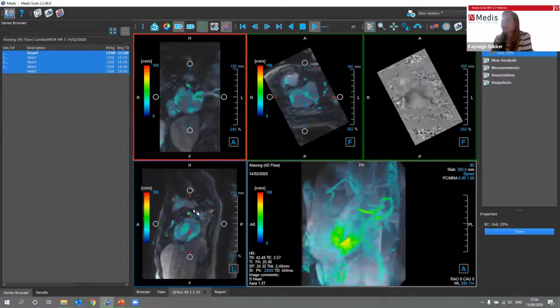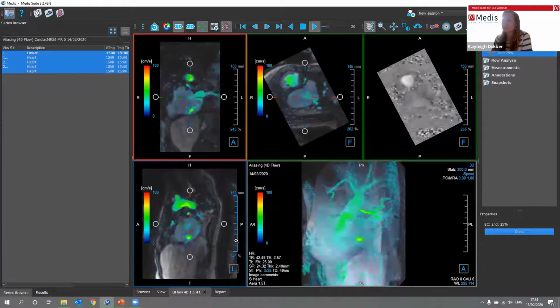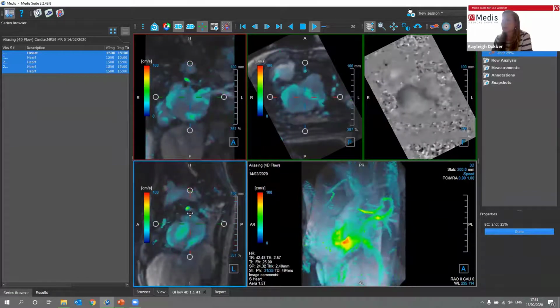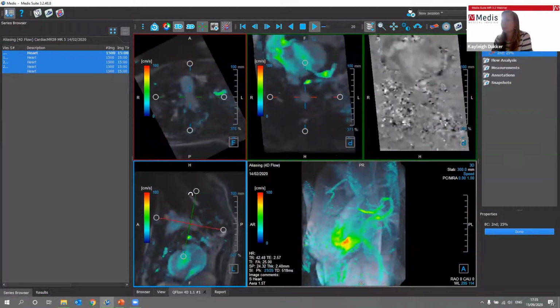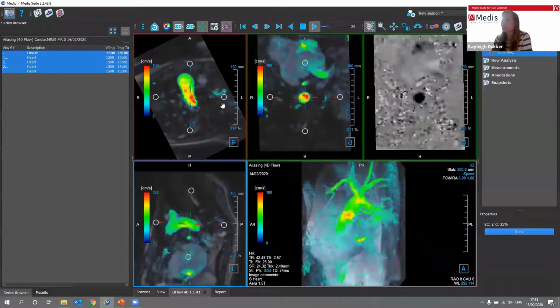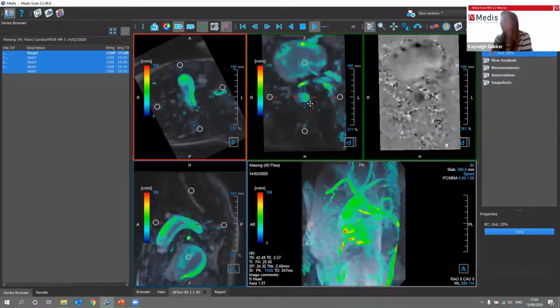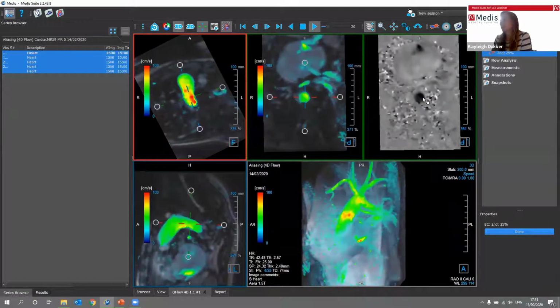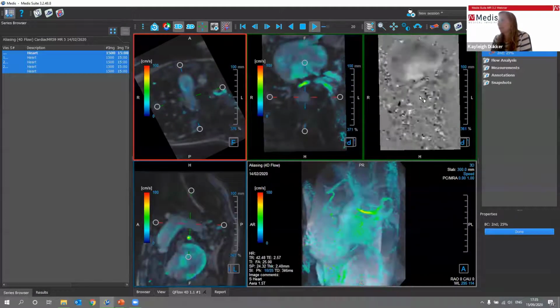And then you can see actually in here that there is a weird band. I hope you can see it a bit. So that's where the aliasing is present. When we go there with our crosshair, you can see it now appearing very well in this orientation, that you can see really those white pixels in black.